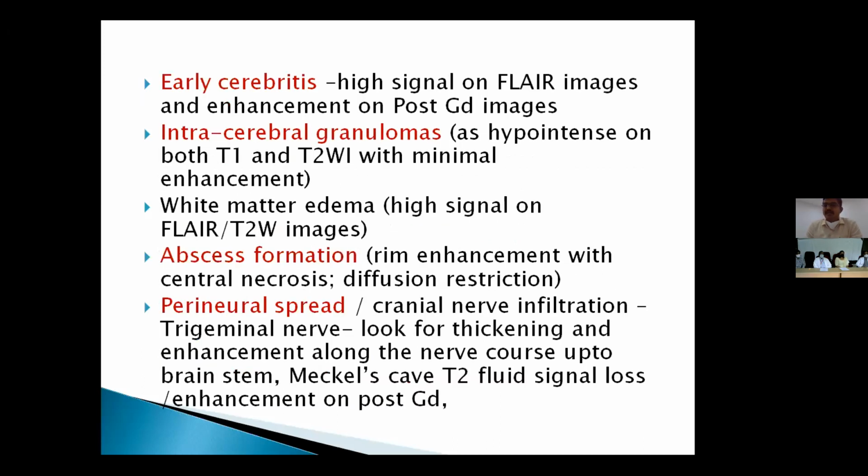Fungal early cerebritis can occur. This will appear as high signal on FLAIR images and enhancement on post-contrast images, which we'll see later. Intracerebral fungal granulomas can result, which will be hypointense on both the T1 and T2 weighted images with minimal contrast enhancement. Also, white matter edema can be present, which will be hyperintense on both T2 and FLAIR images.